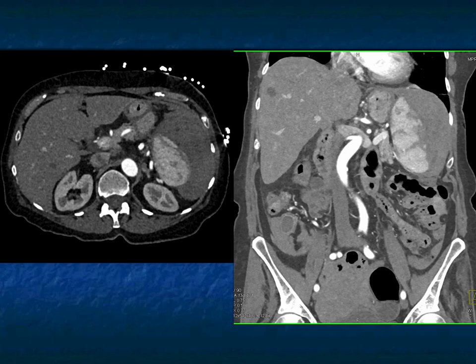This patient has severe left upper quadrant pain, and the patient is within a day of getting colonoscopy. The patient was not in an MVA, the patient did not fall down, the patient was not hit. Well, when you think about it, and you look at these images, it still looks like a splenic laceration with a large bleed, but how's that possible?